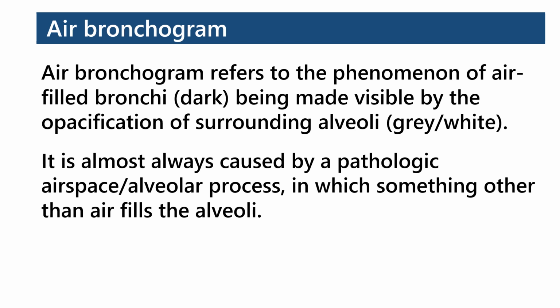Air bronchogram refers to the phenomenon of air-filled bronchi being made visible by the opacification of surrounding alveoli. It is almost always caused by a pathologic airspace or alveolar process in which something other than air fills the alveoli.